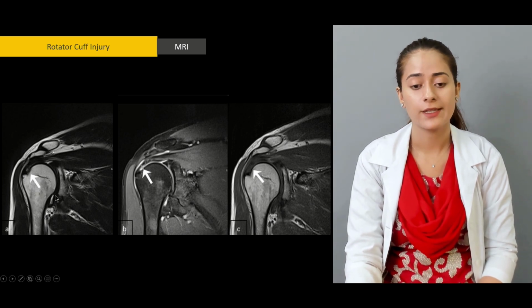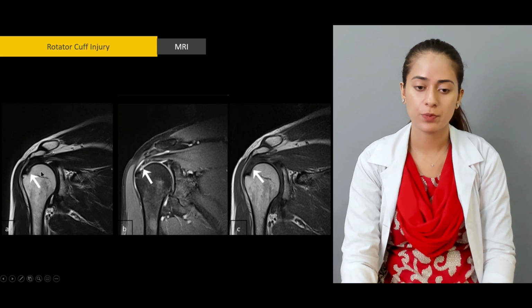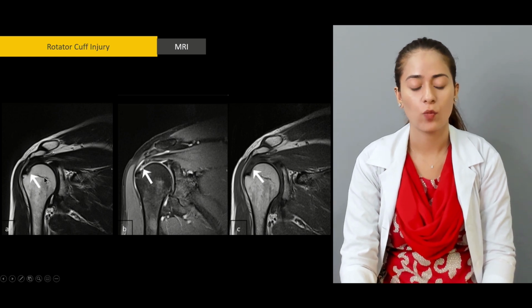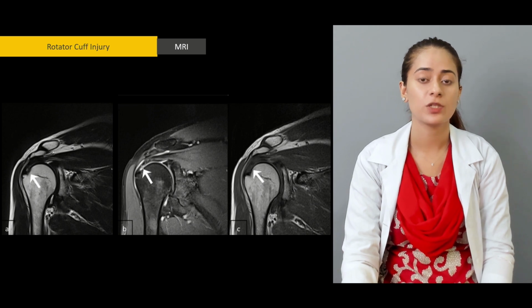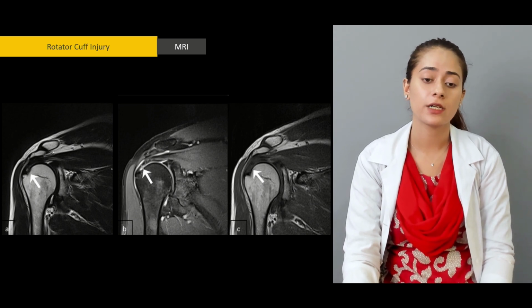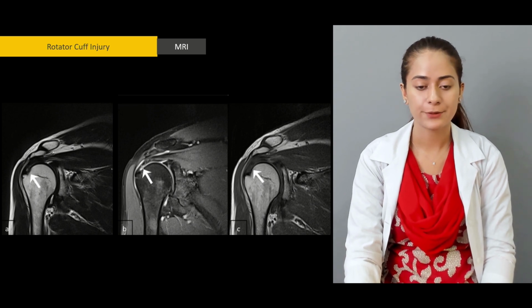of the bone is not very high, and the rest of the places are hyper-intense, which is white. So the fat in T2 is also hyper-intense, which means it's white. The fluid in T2 is hyper-intense, so that means it's white.